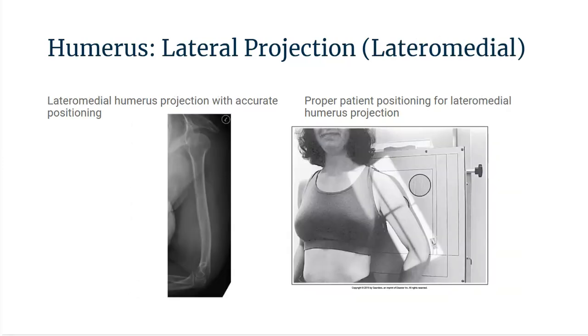Conversely, in a lateral medial projection, the capitulum is farther from the IR, and therefore the beam divergence will project it distally in relation to the medial trochlea. Understanding these positioning principles ensures proper alignment, reduces distortion, and improves overall diagnostic quality.